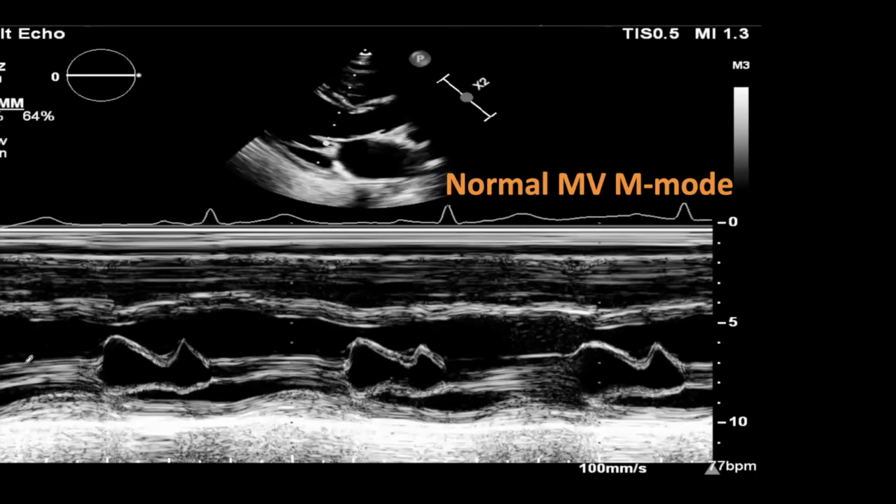When they started echo, they used to have only M-mode. So they used to diagnose everything from M-mode: ejection fraction, LV volume, mitral stenosis, mitral valve prolapse, tumors, you name it. Even, oh, this patient has low cardiac output, just from how the aortic valve opens, like it's tapering, not tapering. It's a whole science. So these are the waves.